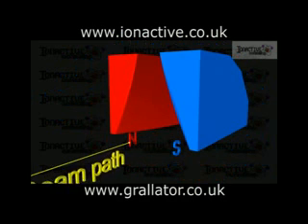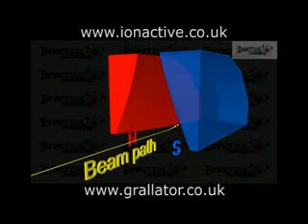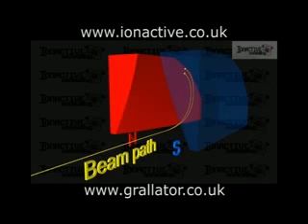More energetic electrons penetrate further into the bending magnet, but are then subjected to a higher magnetic field, decreasing the orbital radius. The net effect is to produce a beam that leaves the magnet with all the electrons passing through the same point and moving in the same direction. It is a so-called achromatic bending system.